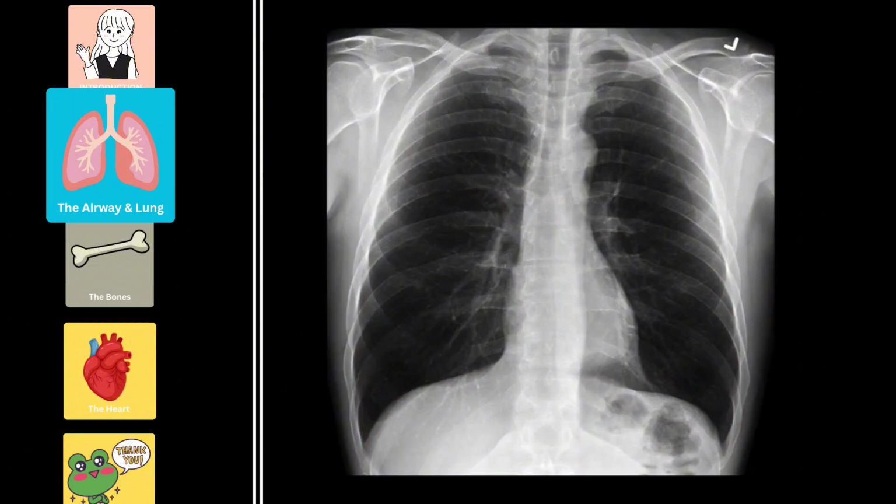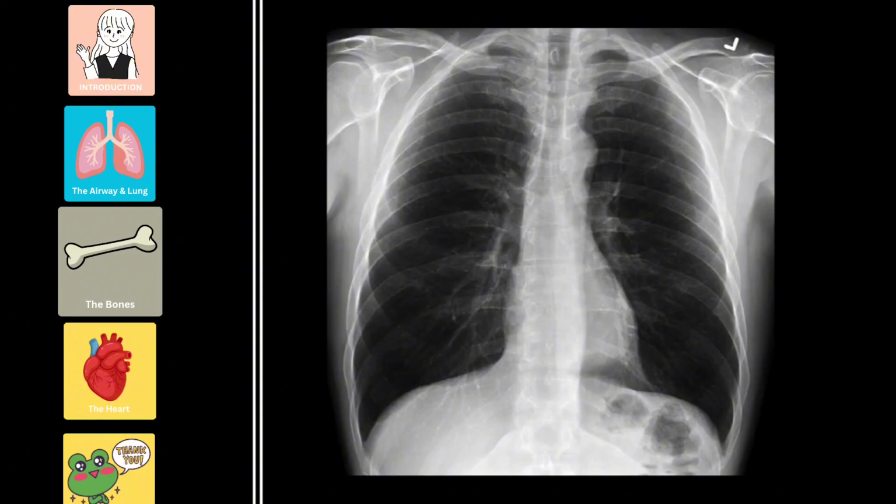If you look closely in the lung fields, they're not completely black. You will see fine strands of white in them all the way to the edges of the lungs. These are the pulmonary vascular markings and will come in handy later when looking for things like pneumothoraces or a collapsed lung. Let's go over the bones.